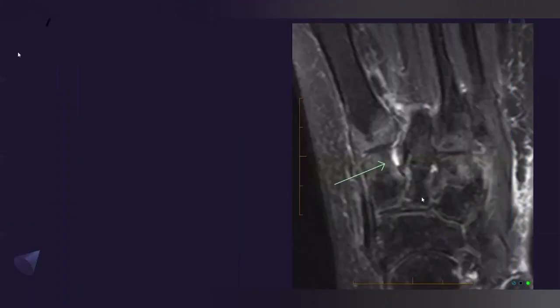Just a dedicated MR of the foot. The abnormality is basically at the Lisfranc joint. So the ligament is torn here. This ligament supports the Lisfranc joint between the base of the metatarsals and the cuneiform. So it's an unusual modality to see this finding, and that's why I showed you this.